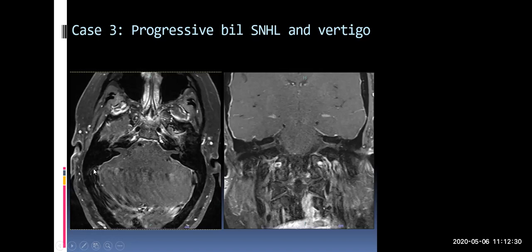And the pathology that you're looking at, this very linear, thin enhancement, actually extends into the internal auditory canal on both sides. And you can see it much better on the coronal images that the entire meninges, leptomeninges are lighting up. It is not unusual to see enhancement in this area. You have to remember the inferior petrosal sinus feeding vessels are all live in this area. So you very commonly see enhancement in the pre-clival area of the meninges, and that's a normal finding.